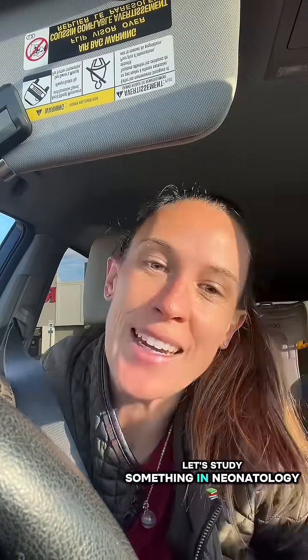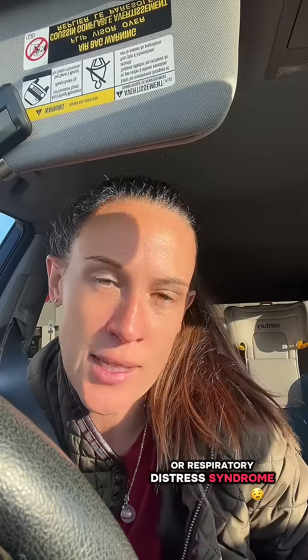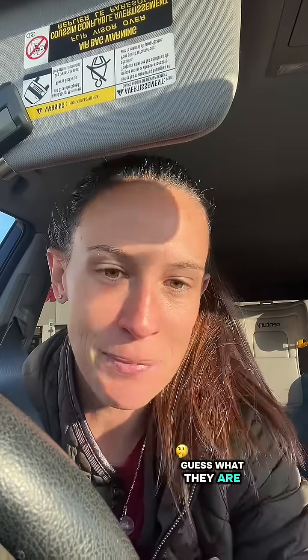All right, card edition of Let's Study Something in Neonatology. I'm going to put up x-ray images, and we're not going to go through the images in detail, but it's going to be one of three common diagnoses in the NICU: either transient tachypnea of the newborn, meconium aspiration syndrome, or respiratory distress syndrome. So I'll put them up and then you can guess what they are.